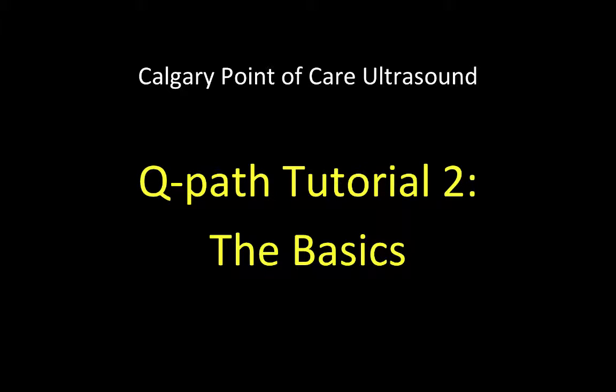Welcome to the Calgary Emergency Medicine Point-of-Care Ultrasound tutorial on the basics of using Qpath. This is part 2 of a series of tutorials that will outline the function of the point-of-care imaging archiving system called Qpath. This tutorial will focus on logging into Qpath, some orientation of the layout of the software, and the basics of how to go about reviewing images.